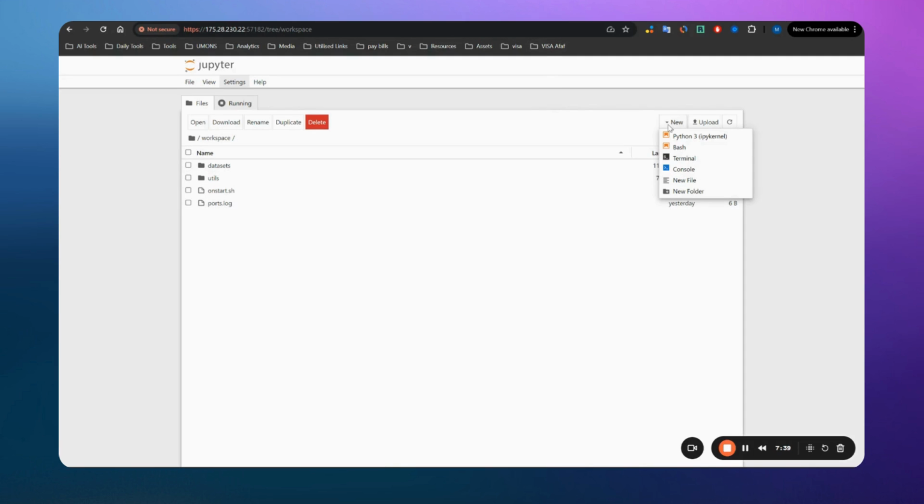Okay, so let me just create a Jupyter notebook here. Let's open it. Okay.